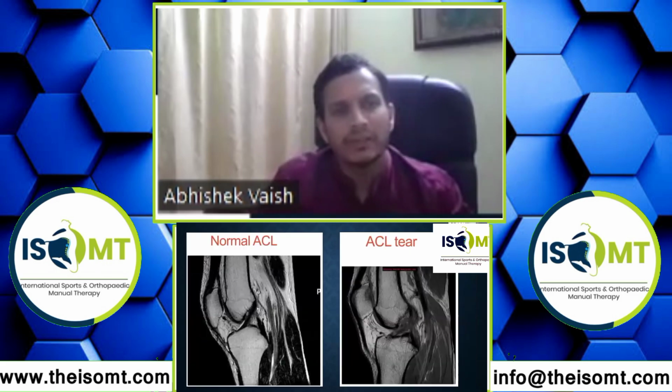Quick examples. This white structure which goes from the femur to the tibia, this is the ACL. This is a normal ACL which looks like a clean structure. And if you see an ACL tear, you will see that the fibers of the ACL are discontinuous, they are thick, they are bulky, and you cannot trace them up to their attachment.